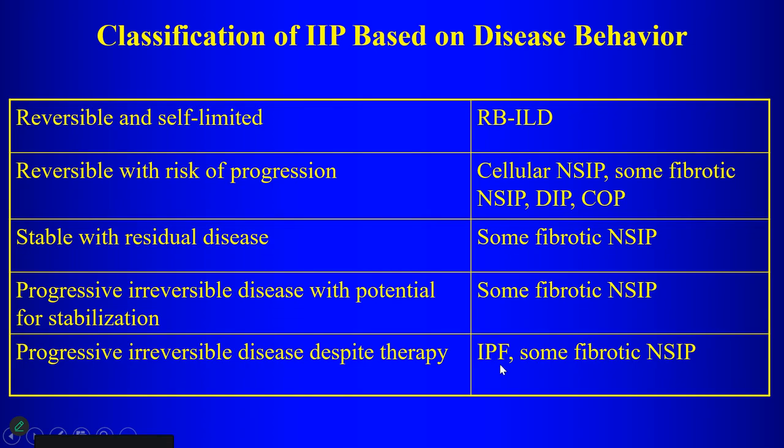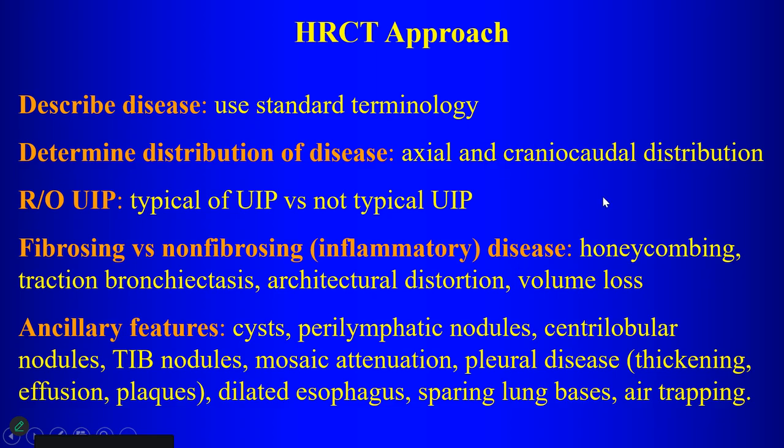Unfortunately, that many times is the case with idiopathic pulmonary fibrosis, and it also occurs along the more fibrotic spectrum of NSIP. So what is our role as radiologists in approaching this?